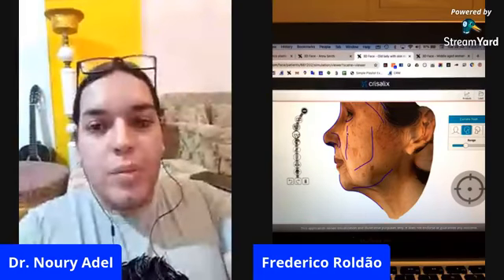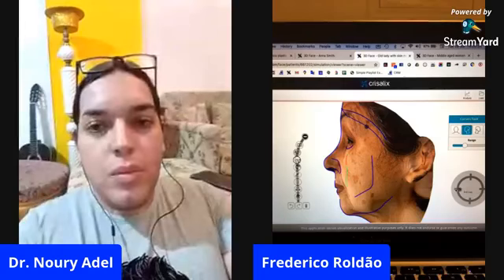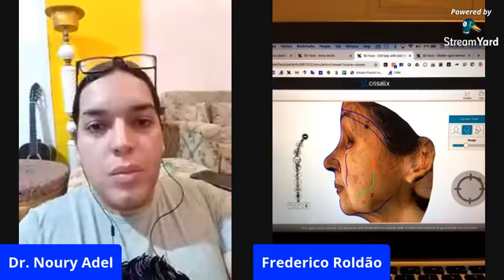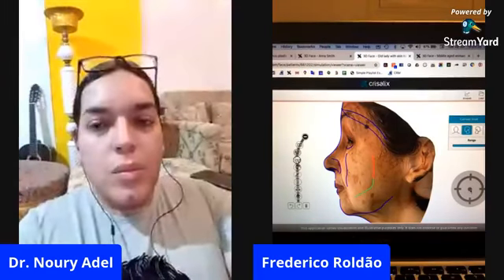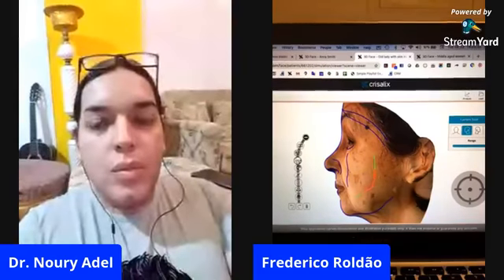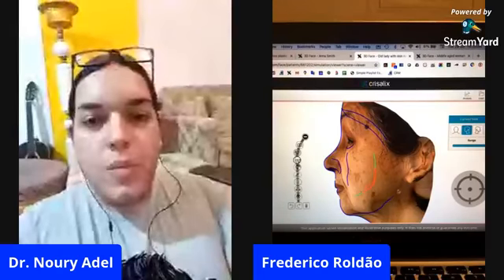I see. I will go on and add some volume here as well. And I will try to stretch here a bit, maybe a bit more. And then I will do something else to complete the effect.